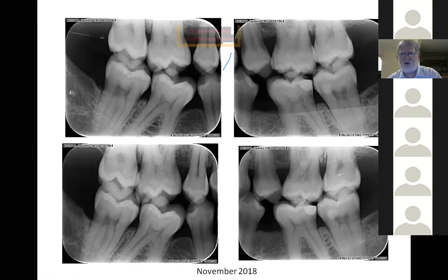The reason for this radiograph is to show you that when you take your bite-wing radiographs, try to standardize the way you take them every time, so that when you are taking radiographs years later, you can still do comparisons 3.5 years later between the top pictures and the later ones taken 3.5 years later. And certainly if you're monitoring or tracking something, then you can do good true comparisons year after year after year.